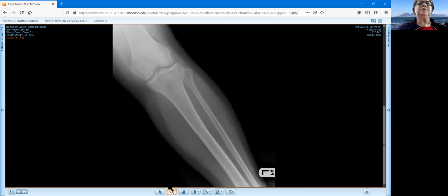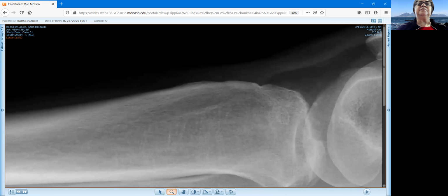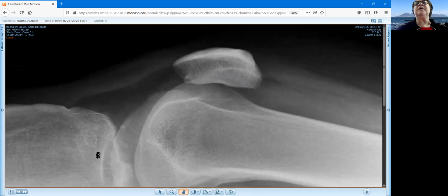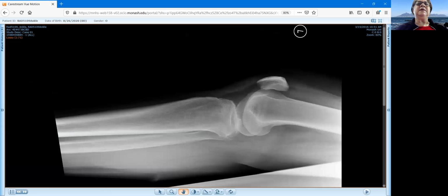And then on the lateral view, let's just zoom in again to the knee area. So on the lateral view, very difficult to see the fracture that we have observed on the AP. That's why it's important that you scrutinize both of those images. But what we can see here is the soft tissue sign, where we have a lipohemarthrosis just above the patella.